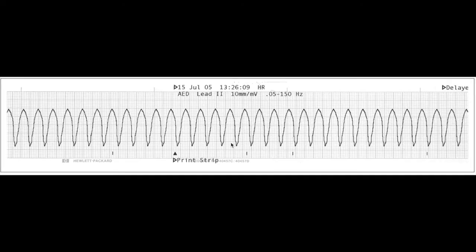This here is an example of ventricular tachycardia, and we can pretty much identify it straight away. But let's do this properly. So starting with our regularity, each little point here looks pretty regular. So straight away it's differentiated from ventricular fibrillation. So we can count the rate of this as well. So I'm going to use the 1500 method because I can count how many small boxes. We can use the points here or the points down here. So let's just use this one here.